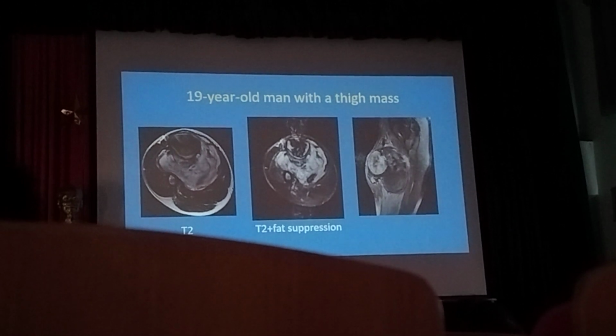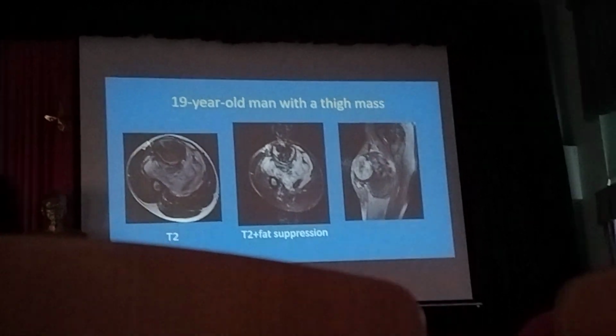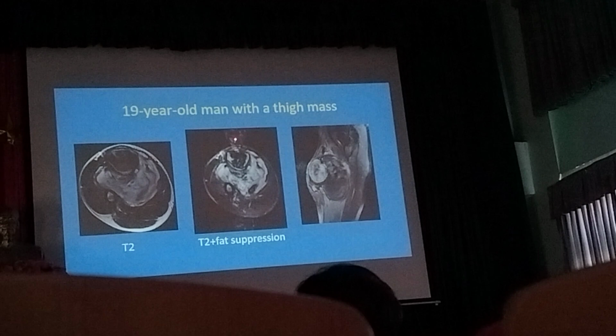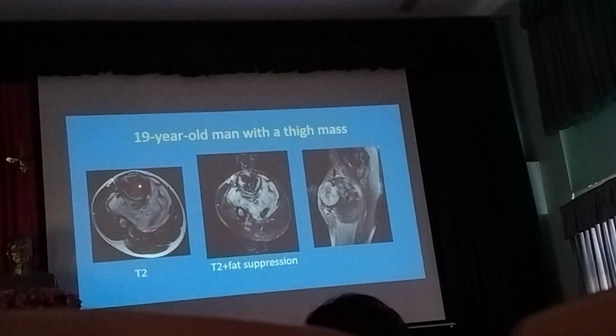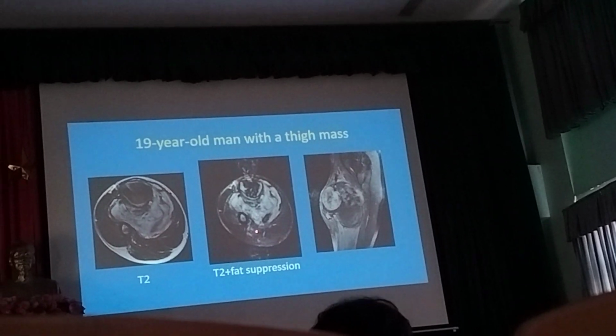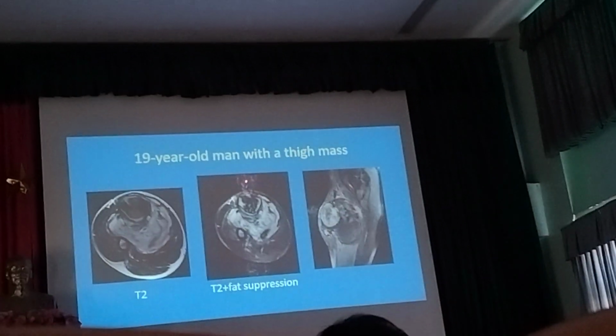Okay, and I want you to be aware of some pitfalls. Like in this one, you can see the heterogeneous mass, which has dark signal here, and you can see something that's funny, it's like a band here.